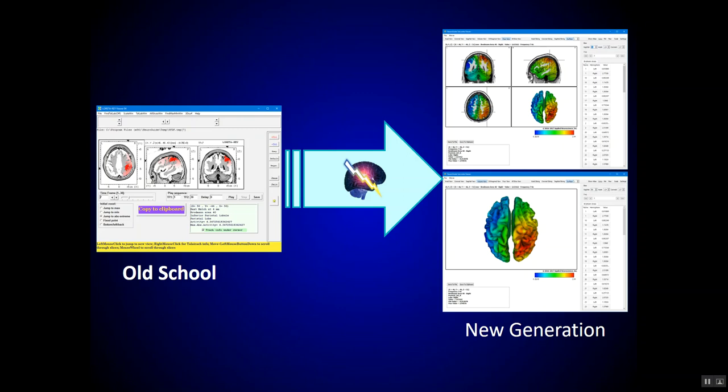Now, the spatial resolution, the 2,394 voxels, is in contrast to this on the right side. This is called sLORETA, and I'll go through in a minute what that means. It has 12,270 voxels, and there are many more tools to navigate through the brain and to organize by networks, to look at both z-scores and raw scores, to be able to tabulate the magnitude of the z-scores or the raw scores, to sort them, to create images, to put into clinic reports or research papers, or whatever you want.